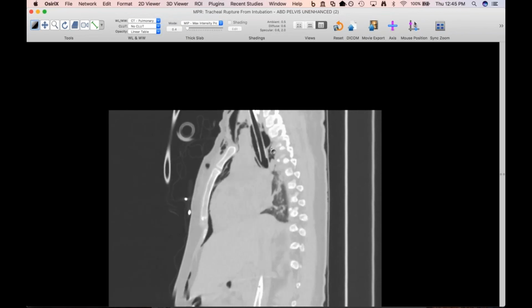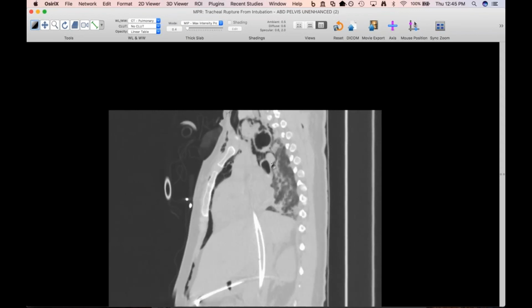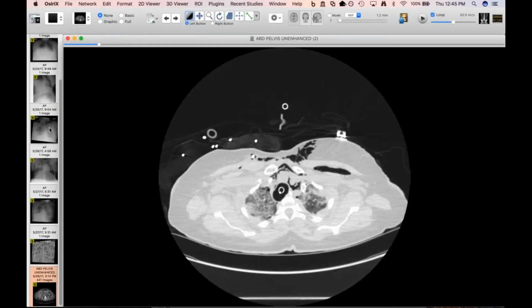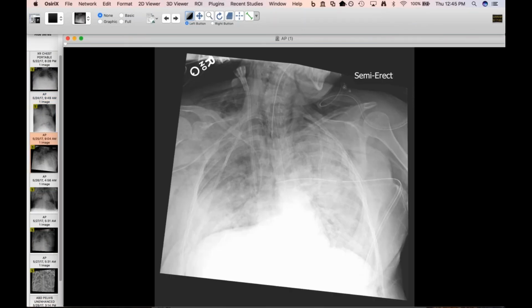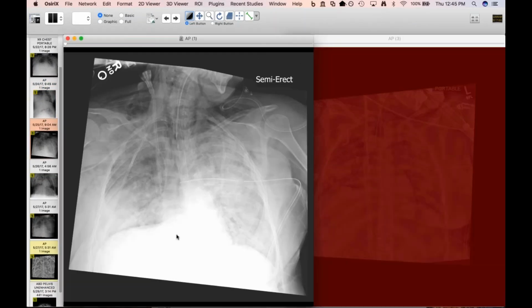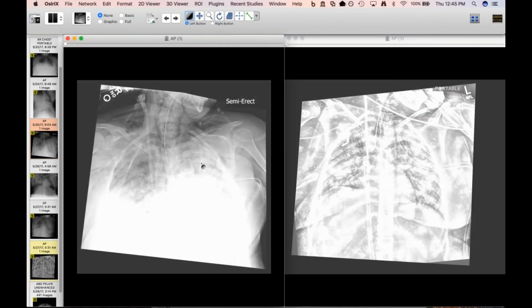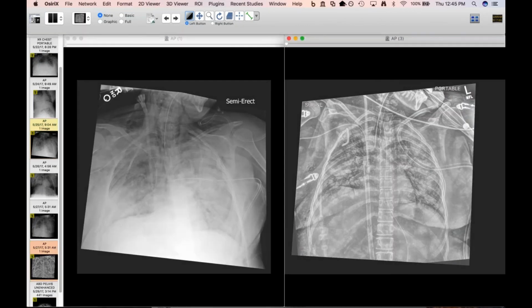I don't know. The limited reading I've done, yes, this can happen during the intubation process too, but one of the mechanisms I read was overinflation of the balloon, especially if there's sudden coughing or movement that causes the endotracheal tube to dislodge or move, which in her case it may have, because if you look at the original radiograph when she was intubated versus the later ones, I think it's in a slightly different location. It's further down towards the carina, as you can see on this image.